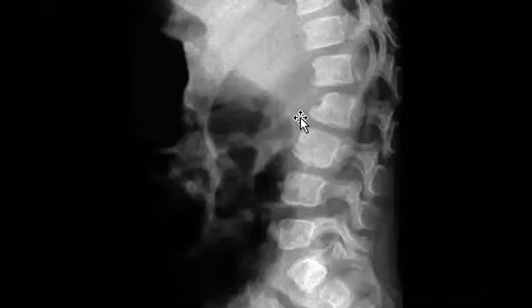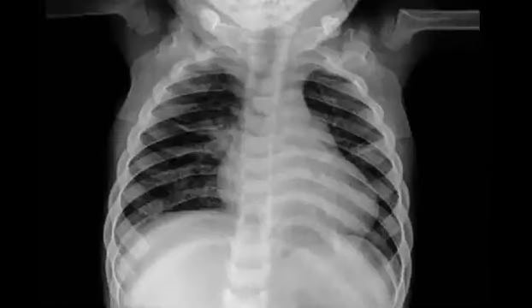Yeah, inferior beaking, Shayma, Marwa, Ala. So what is the other name, if it is midline? Morquio, yeah. If it is midline, Morquio. If it is inferior, it will be Hurler type.